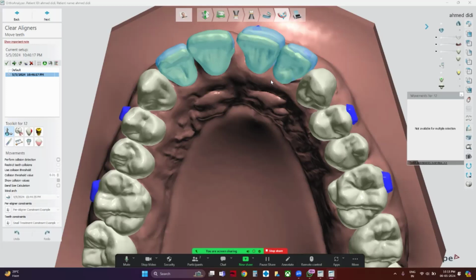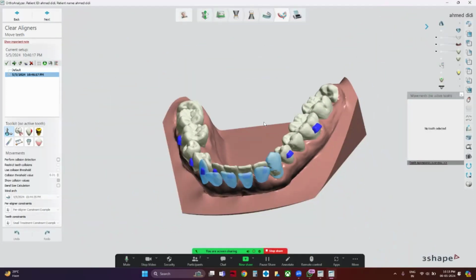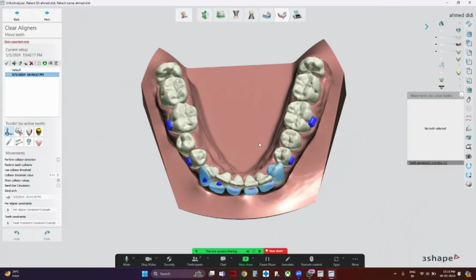If the patient would have had a lot of treatment happening in the lowers, like for example some amount of posterior movement also happening in your aligners, then I would have strongly recommended that you give the upper and lower aligners together. But since you're moving only canine to canine, the posterior separation that is achieved by wearing the upper aligner also is not really going to benefit over here. All right.